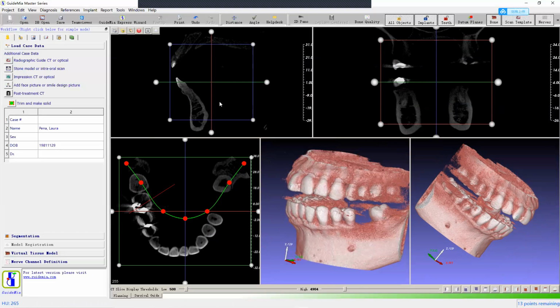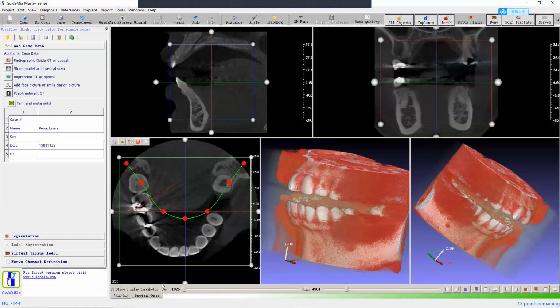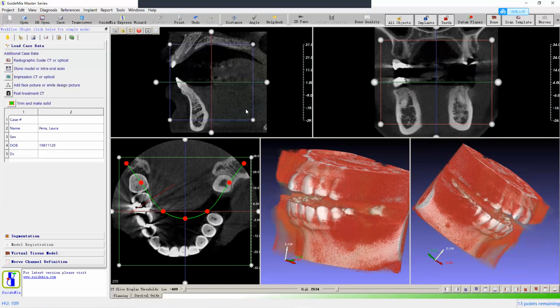We are filtering the pixels so we see a specific range of the CT scan pixels. So if we want to look at the bone, the high density area, we adjust this value. Then if we want to look at the low density area, we go lower. Using these two sliders or using the mouse on the windows, they are the same thing.